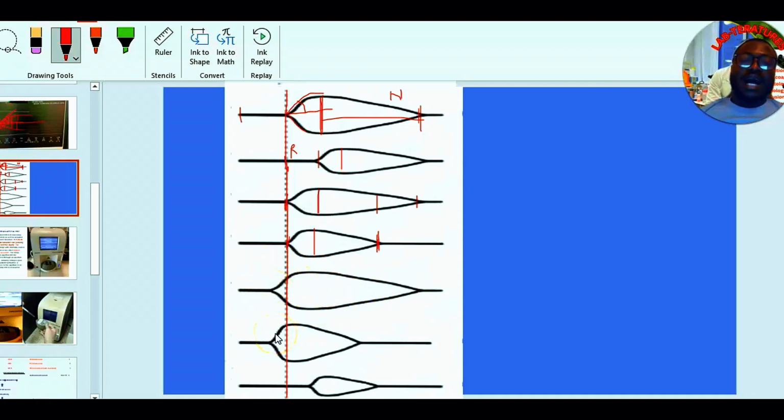Now we have the last two. Pay attention. This hypercoagulable state we talked about, we have it here. And this fibrinolytic state that we talked about, we have it here. If you look, the reactions occurred quicker, and then the fibrinolysis also occurred quicker. This is the first stage of DIC. Disseminated intravascular coagulopathy is a pathological state in which there is a quick initiation of clot formation and, at the same time, an earlier breakdown of that clot. So this is the first stage of DIC.